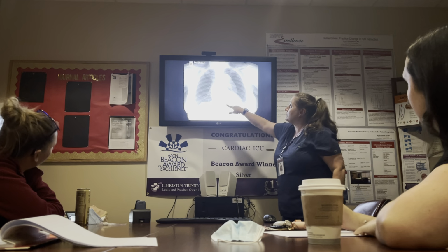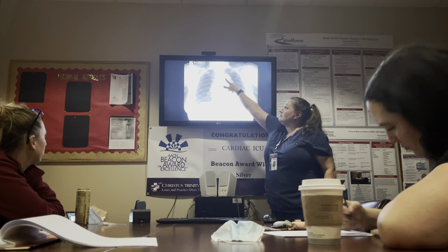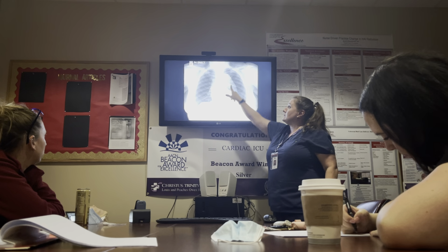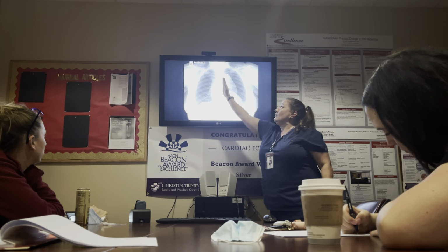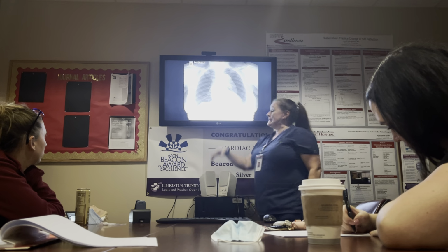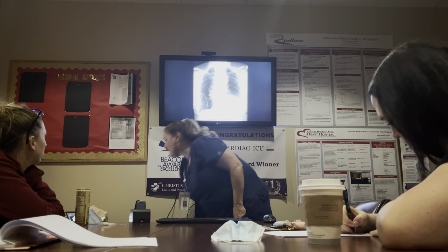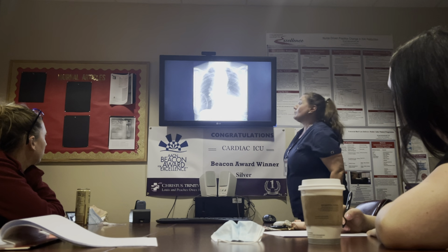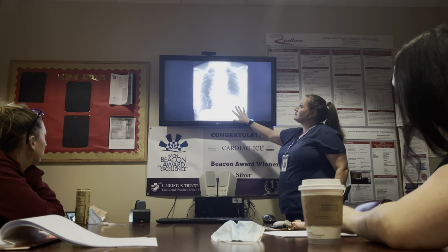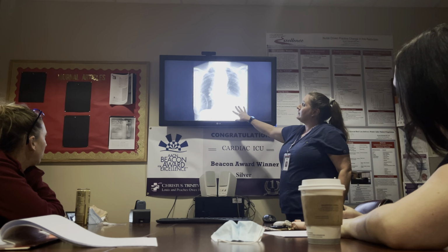Another example of a big aortic, this may involve the arch here from that aspect, but you can see that the silhouette, the aorta should go down this direction, and you can see how it's ballooned out. And here's one that is no longer ballooning out because it's ruptured and you've got blood in the chest. Okay.